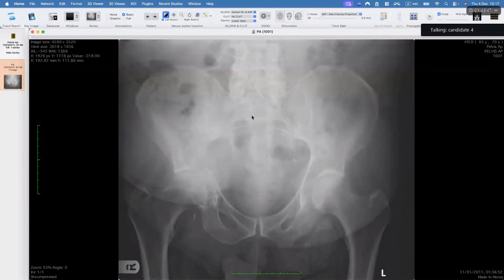X-ray frontal projection of the pelvis of a skeletally mature patient, where I can see a displaced and avulsed left ischial tuberosity, which is giving irregular sclerotic margins. There's also the parent bone of the left side which also appears irregular. Besides that, I'm looking at the rest of the bones. There's also an ossification along the medial aspect of the right femoral neck, and I would like to.